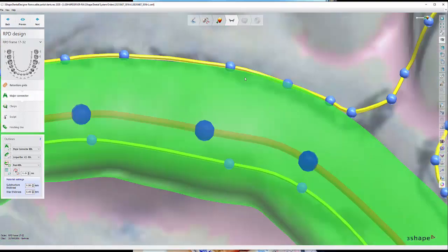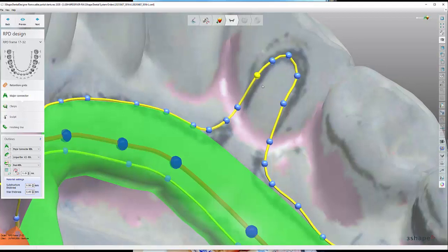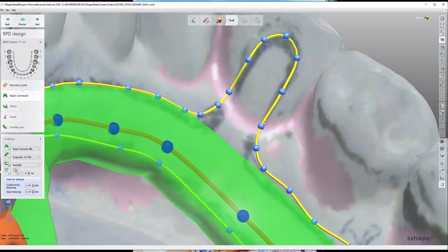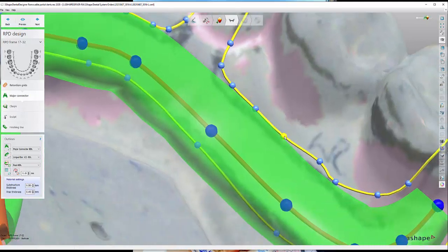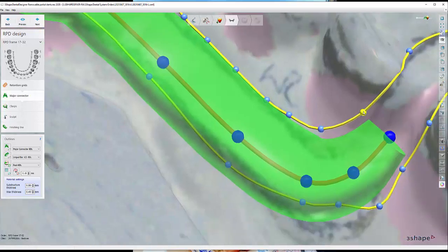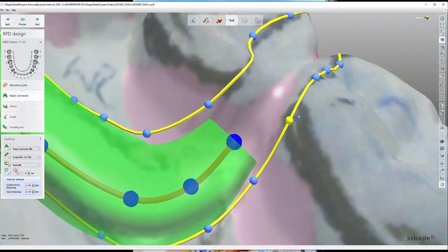I like to think because of the team we have drawing, they're literally just drawing partials all day, that they really know what they're looking for and what's a good design. That makes CAD so much easier because you can just go with the design. They've already been by hand surveyed and drawn on. So again, this transition will turn out really nice if you just follow this leading edge of the bar like that. Come up.